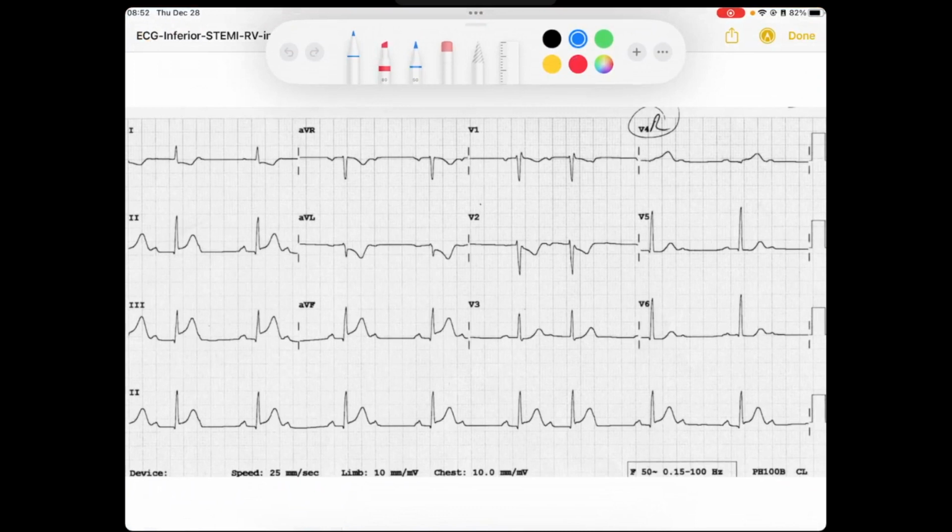So first thing I do is I'm going to go through, kind of look at the forest, look at the trees. We'll look at lead 2 here at the rhythm strip. We'll just look at our QRSs. Ticking away here, not the fastest rate. Seems to be pretty regular. Kind of got this early looking beat. And then we get back on our regularity. I see I have some type of narrow QRS here. There appears to be some P waves. So, okay, that's a good start. So let's figure out what the atria is doing here in our rhythm.